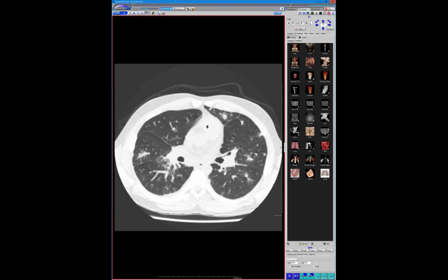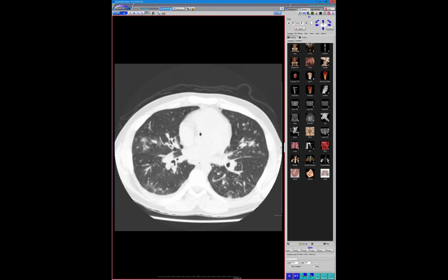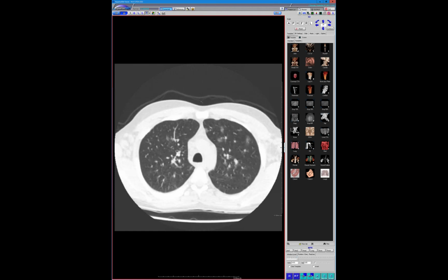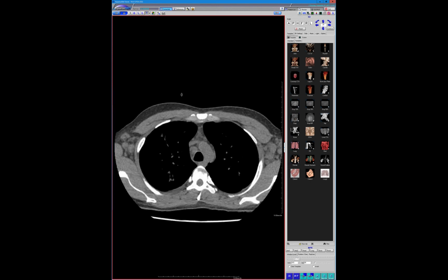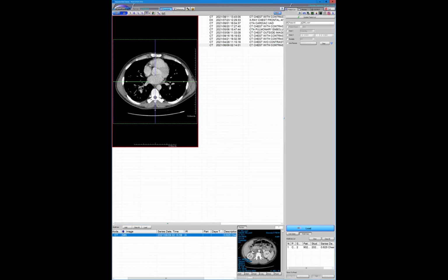So this is a patient with both pulmonary Kaposi's, with nice flame-shaped things in the lungs, and then bulky lymphadenopathy due to multicentric Castleman disease, which are both HHV8 related. This is a non-con, so you can't see it well.